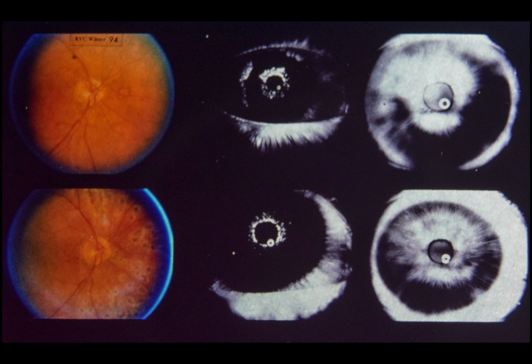Lower right, 4 minutes after injection, note persistent leakage from iris new vessels in the peripupillary region. Amount of leakage is definitely diminished, however, when compared to the pretreatment angiogram above.